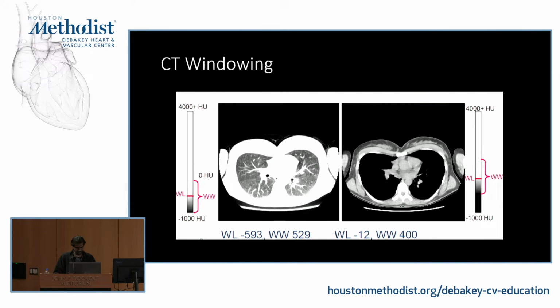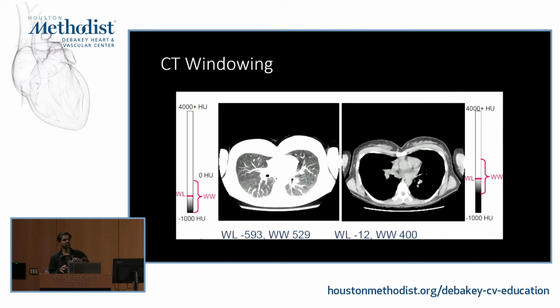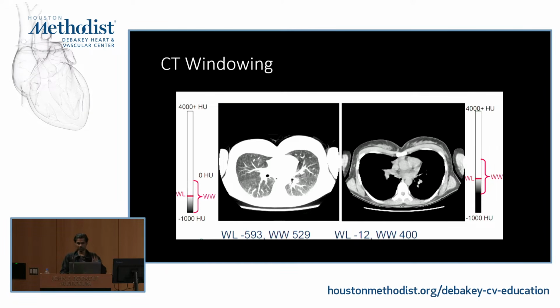I'm quickly logging on to our PACS server. I loaded a couple of training cases, so we are going to go through the windowing values. This is just one DICOM viewer that we have. It is a client-based server that is connected to most of the scanners in the hospital, even the satellite centers. So this is one go-to place, at least locally here in Houston. For example, if I go through DICOM QR, these are all the scanners that are connected to this particular system, and we can import the images here.